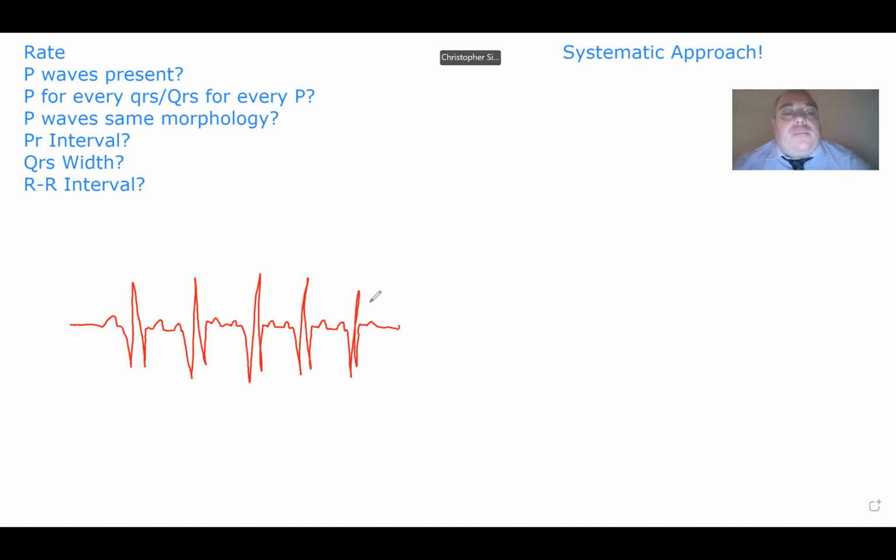What do we notice here? These things are a lot closer together and things are starting to look a little faster, okay?